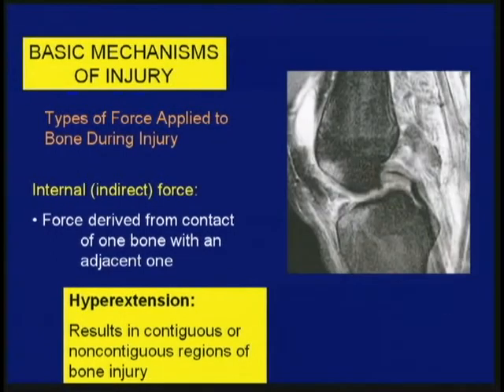So let me show you the example. It's not a pretty image, but we had a great history here. This was a patient who was struck above the level of the knee like that, and there was only some subtle edema right here in this STIR image that showed the impact of the external force. The rest you can tell what happened.